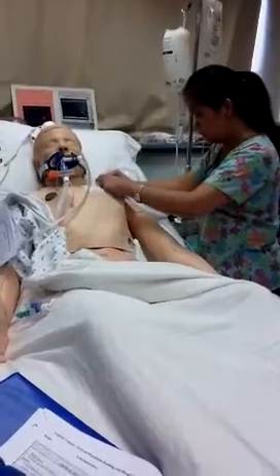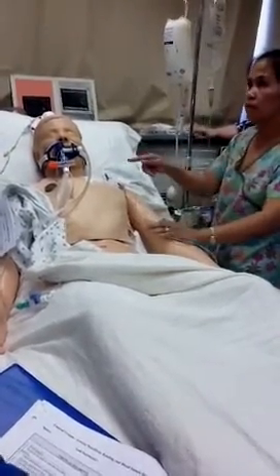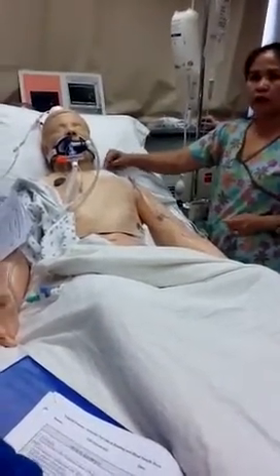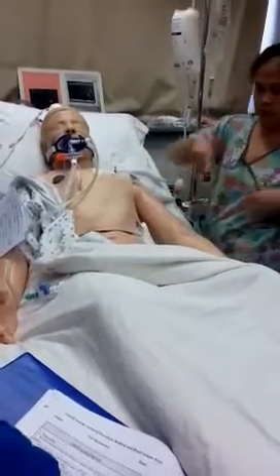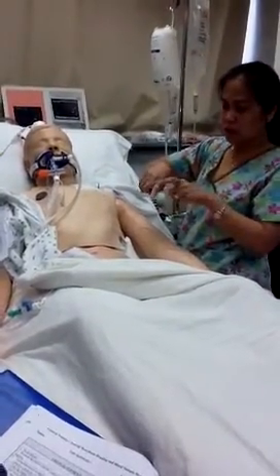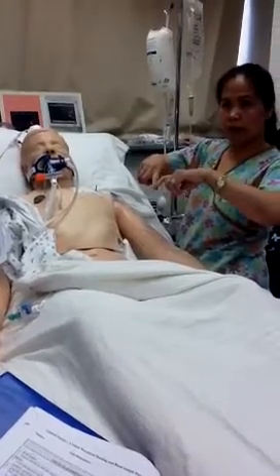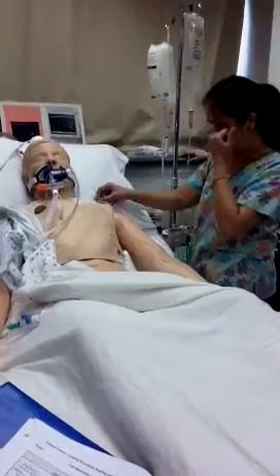What does that mean? Proximal is closest to the patient. Closest to the skin, that's right. So the outside. So this one, the proximal, that means it's closer. So basically, if you have this catheter, think of it: if this is our insertion site, this is our exit site, I should say, in the skin. So the proximal will probably be here, the medial, the distal. Okay? So you just kind of need to visualize what those mean. So yes, proximal to the skin or to the exit site.